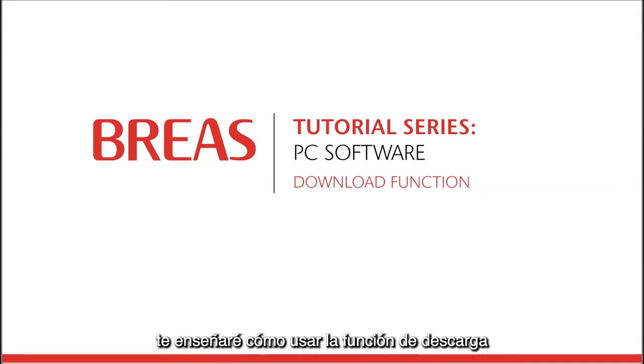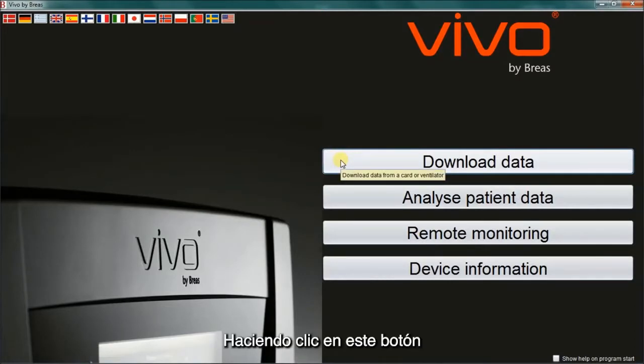In this movie I will show you how to use the download function of the Vivo PC software. By clicking this button you will be able to store patient data on your computer for analysis.